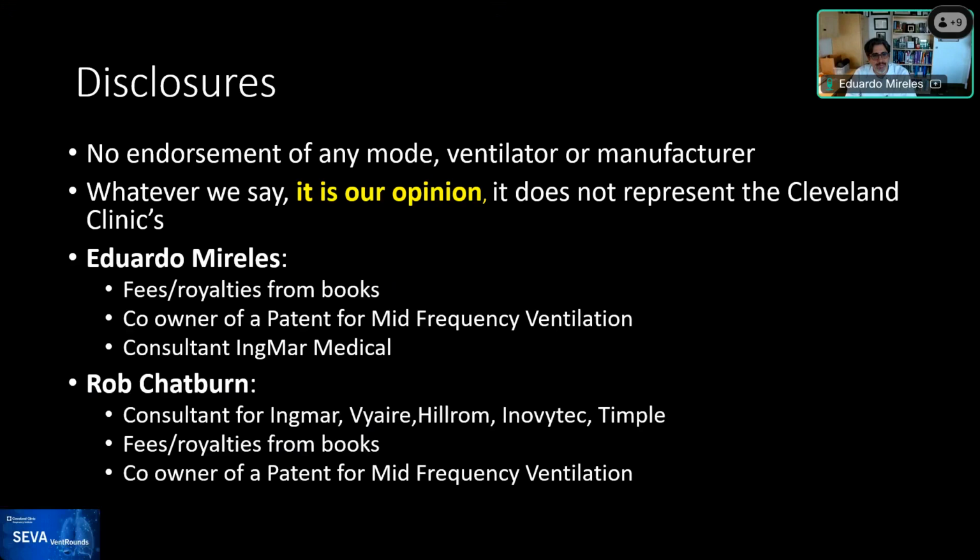Rob? Yeah, you would need to know the inspiratory time of those long breaths. They look like pretty much the same inspiratory time, but you'd have to calculate what they were for each one or measure them or something. Yeah. But if they were all exactly the same, then that would be your clue, right? That could be one of the clues.